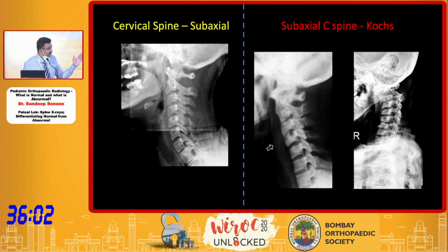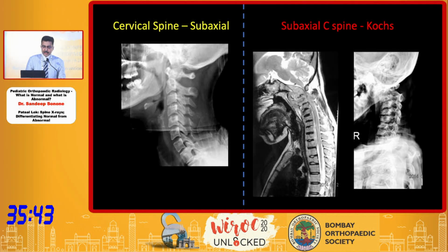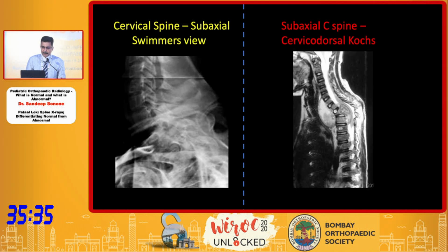Also, the X-ray on the extreme left, the most obvious thing is the presence of an atlantoaxial dislocation. However, if you see all the bodies over there, the margins look very fuzzy, and that should give you a suspicion that this is not only atlantoaxial dislocation, this is a deviation from the normal, and this patient had extensive TB, which turned out to be total drug resistance, which was not salvageable. So these are the diagnoses which you can easily pick up.